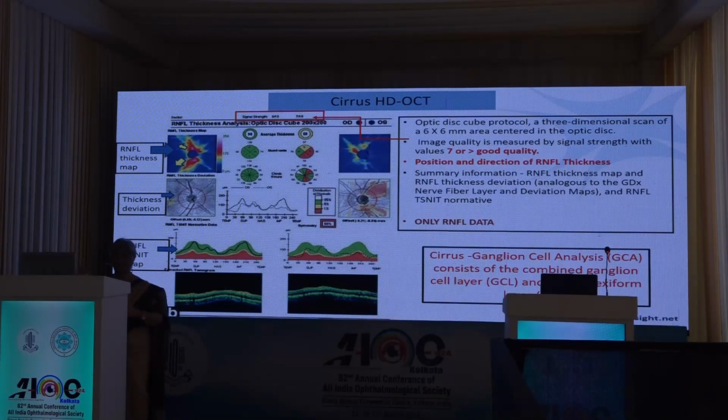So that is telling us what is the deviation. Now you're going to compare the two with the normative data. Now this I will tell you: what is in green is the normal people. What is in yellow is borderline. What is red, of course, is very highly diseased.